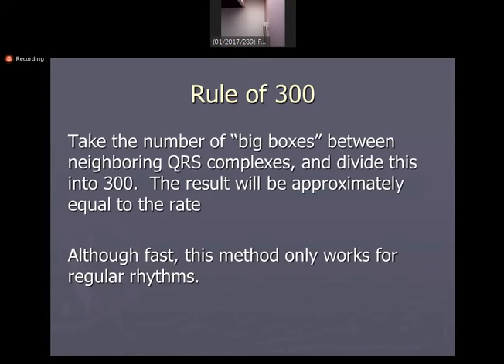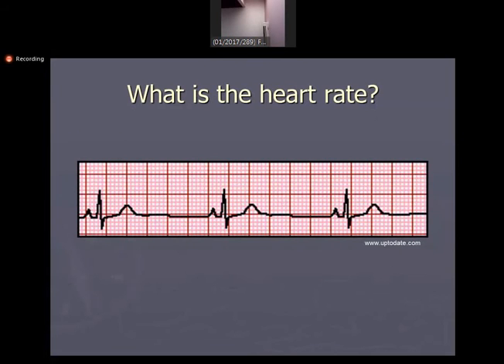Now, this is the most important strip. Either you are in medicine, in gynae, or in surgery, if you understand this strip or this slide, you can see most of the normal or abnormal ECG.